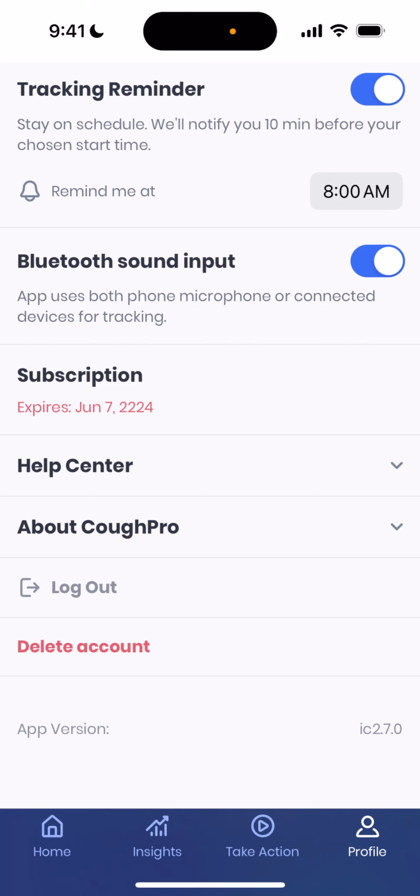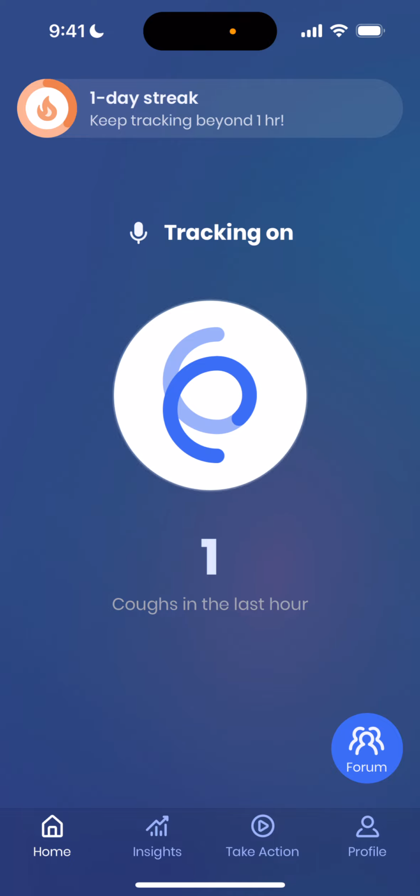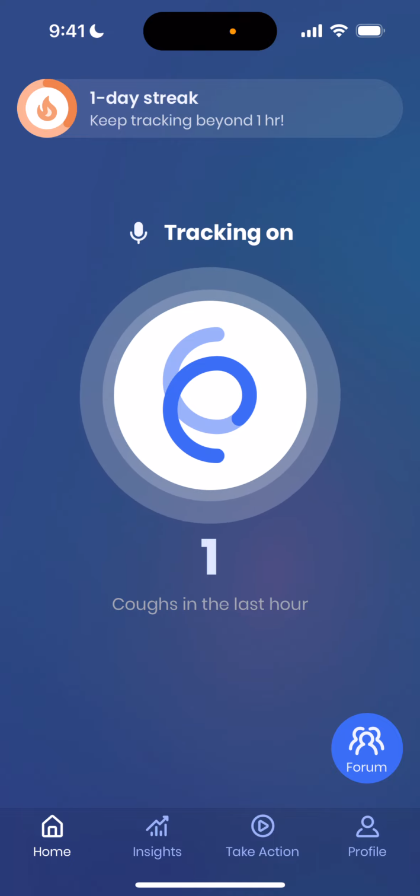And there you have it, a high-level overview to Hype's CoughPro app. Visit our video tutorial library to learn more about CoughPro product features such as insights and cough management.